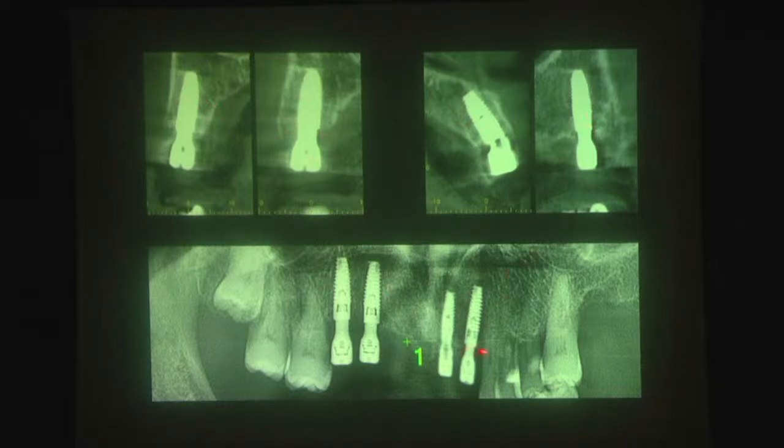You can see the abutment, which is angulated around 17 degrees. This is a straight one, this is a straight one, straight conical connection, but here, an angulated abutment. So 1 tilted plus 1 angulated means a straight structure.